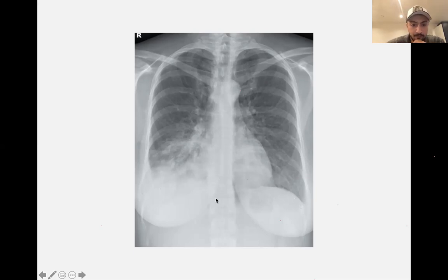Now, if I want to present, I'll start with the same things: the name, date, and date of birth, and then I'll go through A, B, C, and D. So let's say I go through A, the windpipe is not deviated, it's normal, like I said. And then when I comment on the breathing, the lungs, you can see, obviously, the opacification in the right lung in the lower zone, and you can also see there is no right costophrenic angle that is visible.